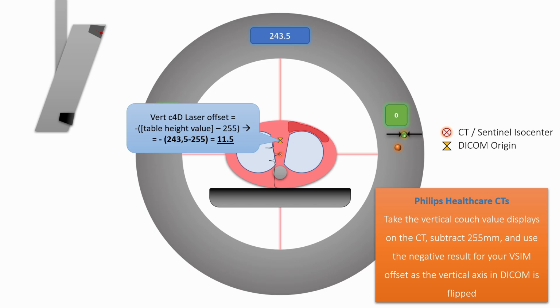As this procedure is rather complex, it might be more convenient to use the CT reference point option for Philips CT users instead. But note the additional offset between free-breathing Sentinel surface and deep inspirated TPS surface mentioned before. This can be avoided by updating the C-position reference after the first fraction of Catalyst. You can see how to do this in another c-RAD education video.